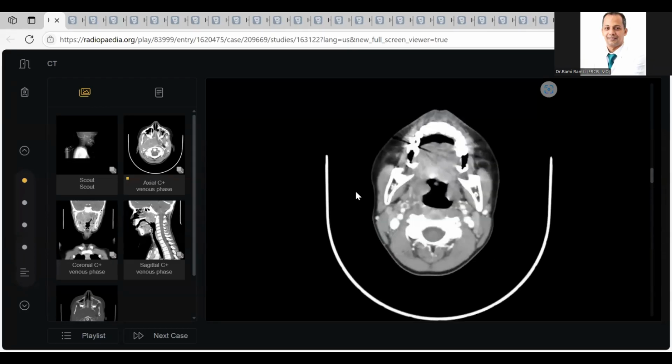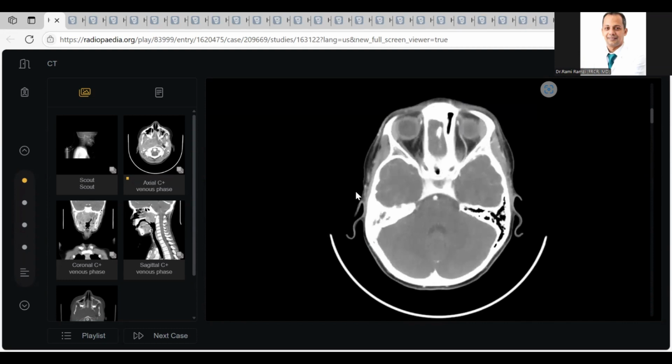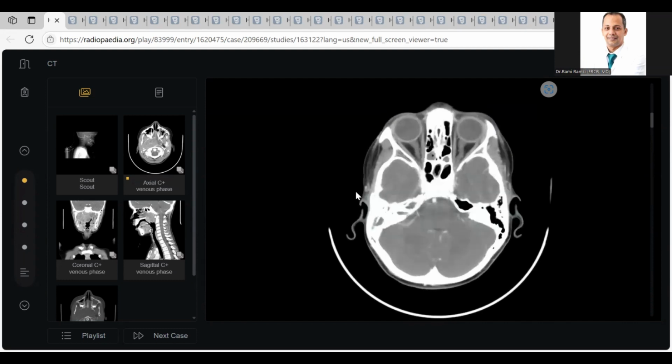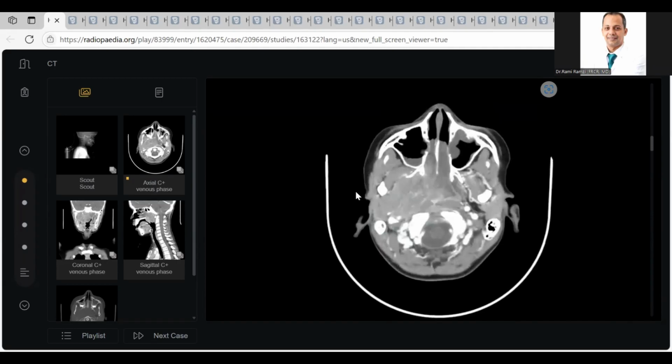It's a highly vascular lesion centered in the nasopharynx. I would ask about any history of nasal bleed. This is concerning for nasal angiofibroma. I would also like to correlate it with the coronal and axial imaging and look at the bone window for any bony remodeling or erosions, and refer the patient to the ENT surgeon and interventional radiology for endovascular embolization of this lesion.